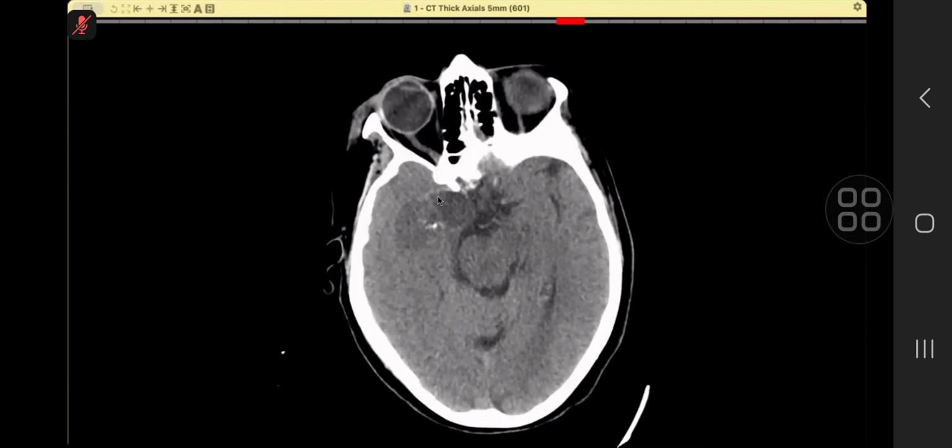Madam, excuse me. You see, in the exam, you don't do this. You don't point out lesions, you speak what you are saying. You cannot do this, that I am looking at this and you point out that this is the lesion. You describe it. Don't use your mouse unless it is needed or it is asked.